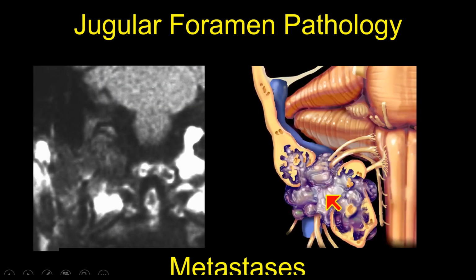So anytime I have a marrow replacing process like metastatic disease, I know that that can be very obvious on the pre-contrasted T1. And again, depending on if you pay attention to your fat saturation or not on your post-contrasted imaging, that may be a lot more confusing, where the pre-contrasted T1 clearly shows you where there is fat and where we've lost fat in a marrow replacing process.